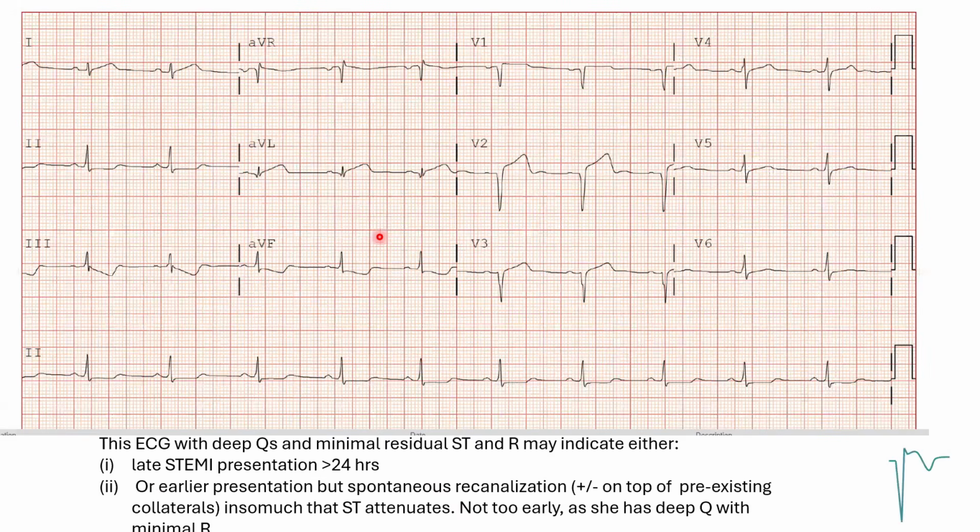Now, this EKG with deep Q and mild residual ST and R suggests late STEMI presentation more than 24 hours, but it may be an earlier presentation with a spontaneous recanalization. So I would not exclude a benefit from revascularization in this patient based purely on the EKG. If this patient has a history of presenting more than 24 hours ago with no ongoing chest pain, and this EKG, I would call this mild ST elevation because it's a late STEMI.